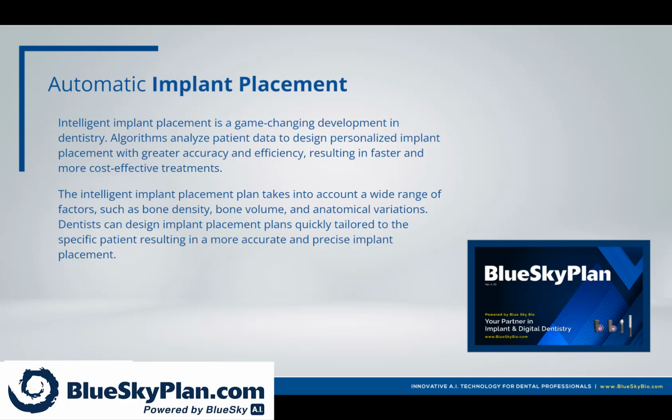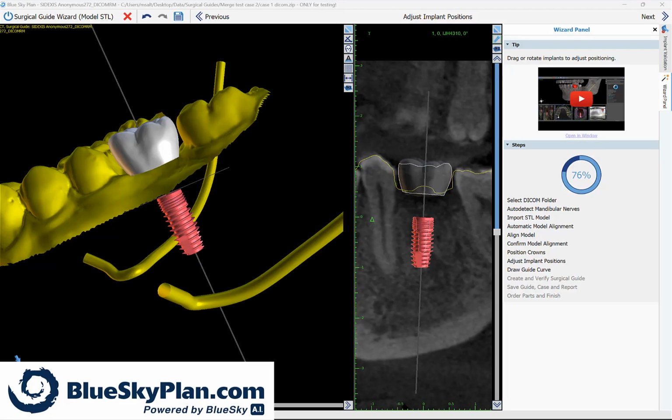This is Michael from Blue Sky Bio, and in this tutorial video, I will take you through the step-by-step wizard process flow for 1 or 2 implant planning cases. What's incredible about this process flow is that you're prompted step-by-step to go through the flow, but really, pretty much every step has become automated.